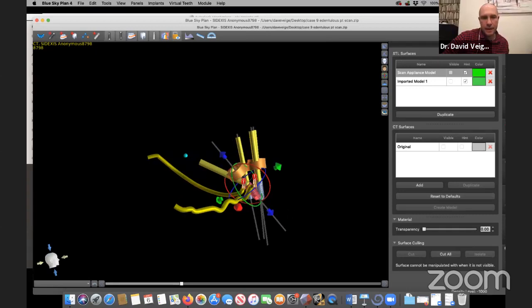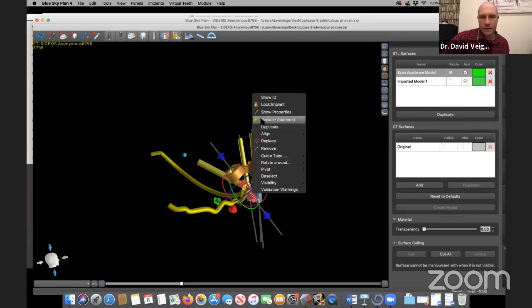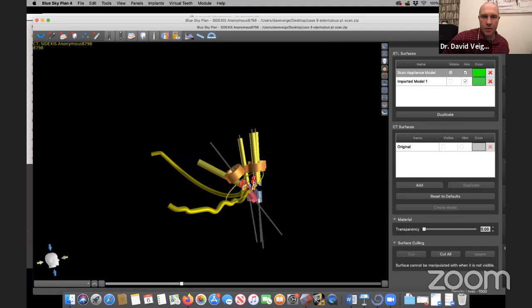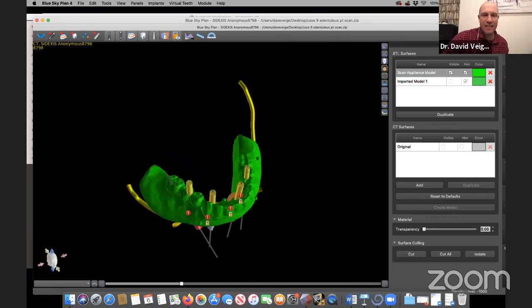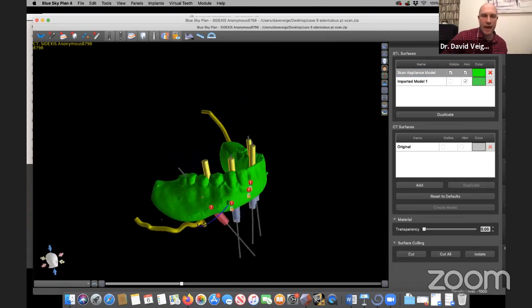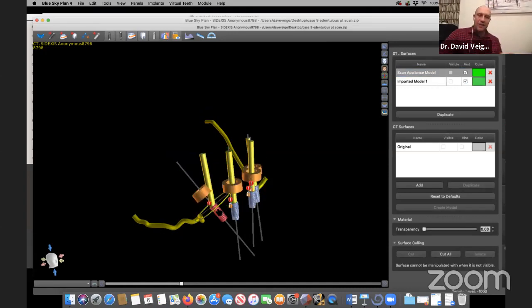Okay. Now I'm going to rotate this abutment along the long axis, and I'm going to rotate it so the screw channel is again through my prosthesis. So let's say it's there. I just rotate that around, and there's my 30-degree bend. Now I need to control the timing of that implant so that when I've placed it and put on my hexed multi-unit, that screw channel is going to be in the right position.